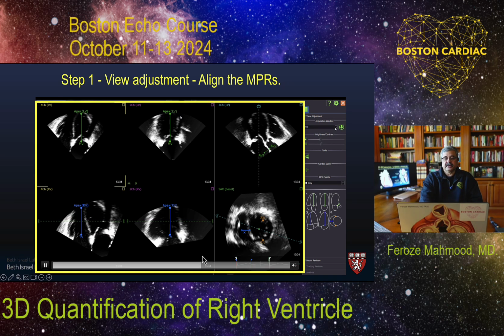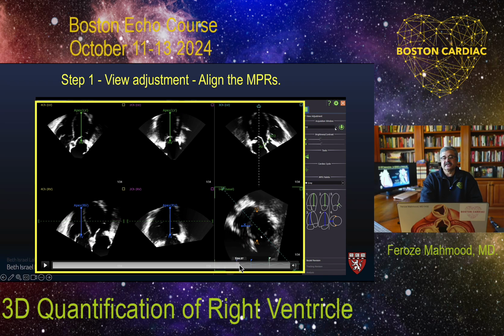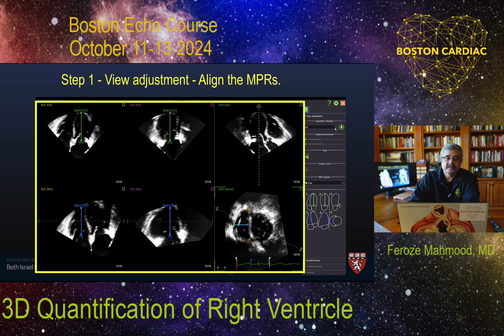We'll do that. It is almost there. I'm going to scrub through this to make it, as you can see, this is being dragged over here now and is being brought to conform to the width of the right ventricle. And now we have it all aligned in one space, in one line.